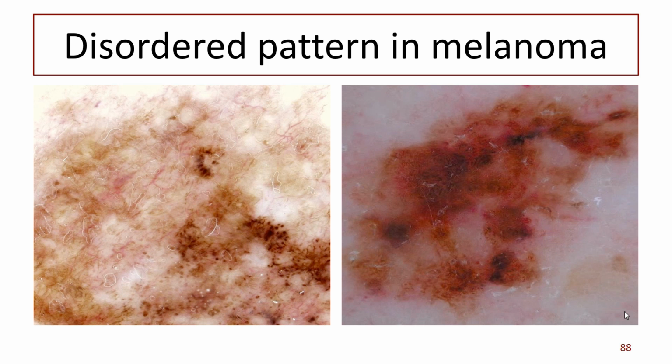We've still got the same structures, so if we look very carefully, we can see some lines, maybe here's some more. We can see some dots, maybe even clods. And we definitely see structureless zones. But they're no longer forming symmetry. Same with this one. Here's some dots. I don't see any clods in this one, but there's certain dots, lines. Where are those lines? Ah, here they are. Just a tiny little bit of line left.